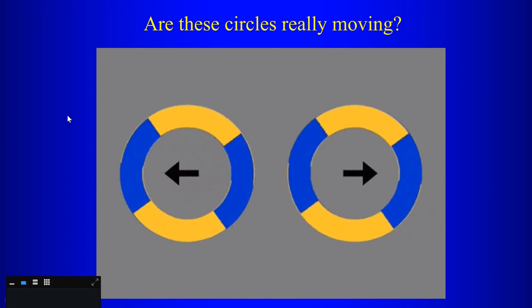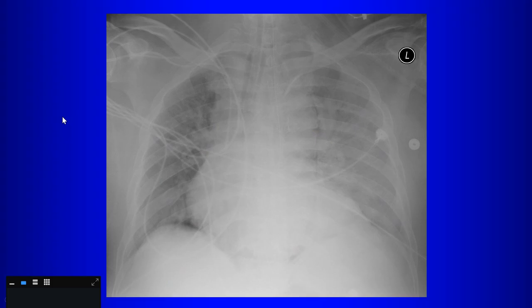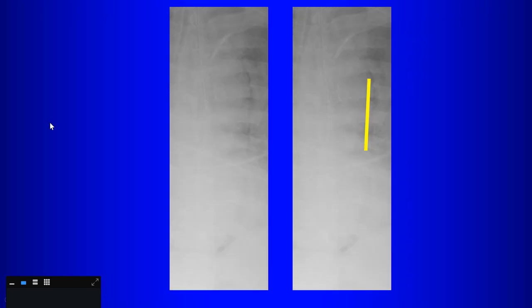So how does this come into radiology? Well, if you look at this radiograph, is this a pneumomediastinum? There seems to be that lucency alongside the descending thoracic aorta, and we do get calls from referring physicians that see stuff like this, and they ask if that's pneumomediastinum. The interesting thing is, if I just cover that edge of the aorta, that lucency seems to disappear, right? So what is it that we're looking at here?